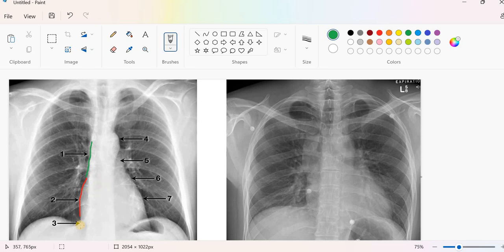If we go a little down, near the junction of this right atrium with the diaphragm, the part between the right atrium and the diaphragm will lead us to the inferior vena cava. So this part is the inferior vena cava piercing the diaphragm from the abdomen going inside the right atrium. So this is on the right side. Again, let us revise. We have the right border of the heart, which is equivalent to the right atrium. Its upward extension is the superior vena cava. Its downward extension, nearby the diaphragm, this is the right copula of the diaphragm, is called the inferior vena cava.